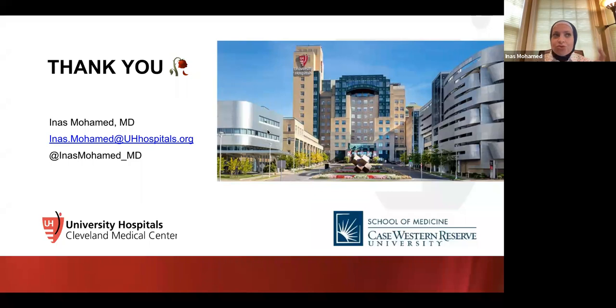You have to examine every lesion separately. This can be a focal nodular hyperplasia, but the patient also has an adenoma, or a cyst. So you have to interrogate each lesion separately. And yes, FNH can coexist with adenomas, and that's why we send these patients to do EOVIST.